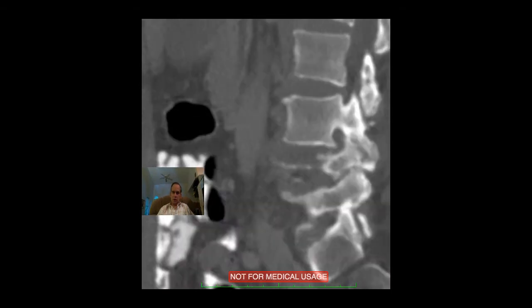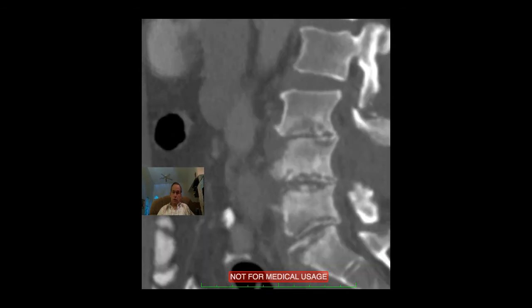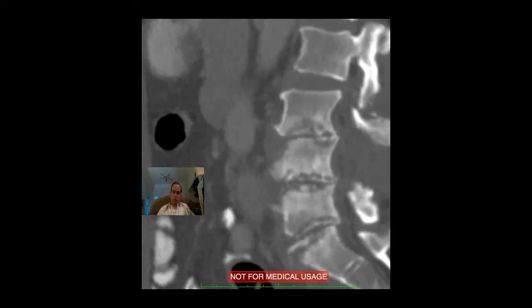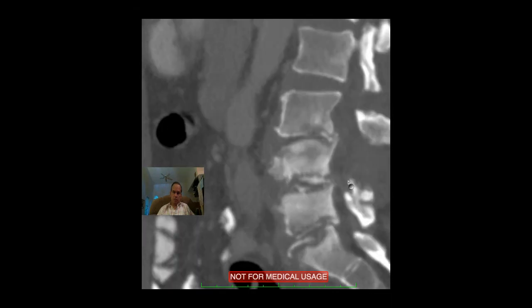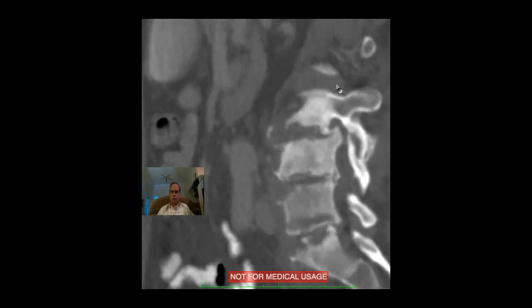laminectomy at L4-5, or rather at L4, probably for problems occurring at the L4-5 level. And severe disc degeneration at L3-4 and L4-5 and L5-S1, but pretty good preservation of disc space height at L2-3.